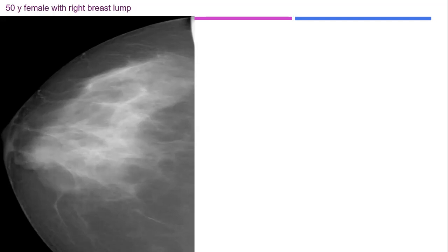It is obscured with the associated ductal extension towards the nipple. Excellent, these associations. What else? It seemed to be thickened, as you mentioned before. There is some thickening of the retroareolar complex, and this band-like density.